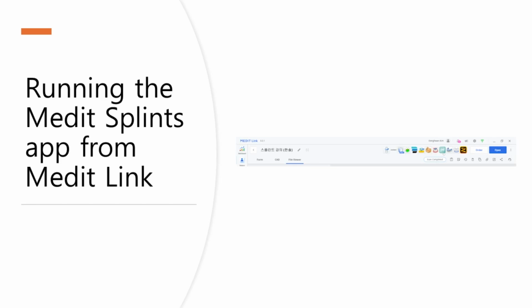To run the Medit Splints app from Medit Link, you select a case within your Medit Link account, either from a clinic or lab account. The Medit Link platform integrates with the Medit Splints app, facilitating a streamlined workflow from case selection to splint design. This process leverages the seamless connection between Medit's software ecosystem, allowing for efficient management and creation of dental splints.